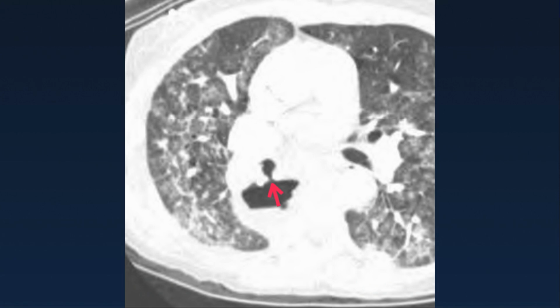So the patient went on to CT. As I mentioned, they were post right lower lobectomy, and now we see bilaterally these ground glass heterogeneous opacities. Some of this could be edema. There's certainly maybe a component of atelectasis, but you'd still be concerned about a multifocal infectious process or even aspiration. What the arrow is highlighting is a defect in the airway that is communicating with a larger air collection.